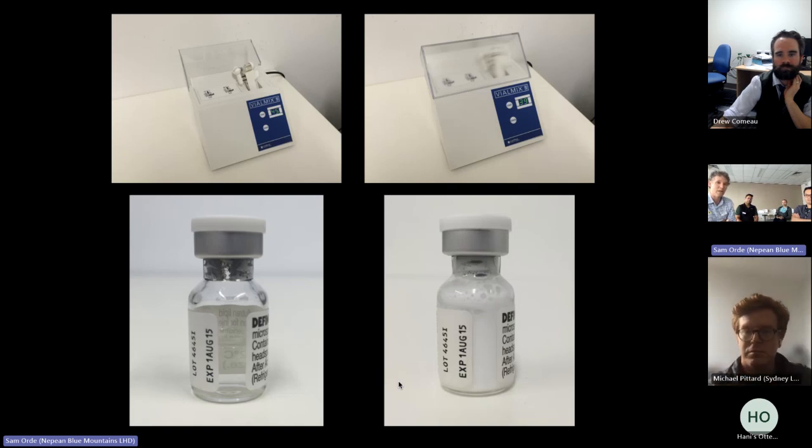It's meant to be 1 vial per patient is how it is sold. I'll be honest, at $150, I don't do 1 vial per patient. Sorry, Definity company. If we've got a group of people, like when we do our contrast clinics, we will use 1 vial between 2 to 4 patients sometimes to try and save money, because this is not reimbursable on the Medicare rebates at the moment, particularly for inpatients.